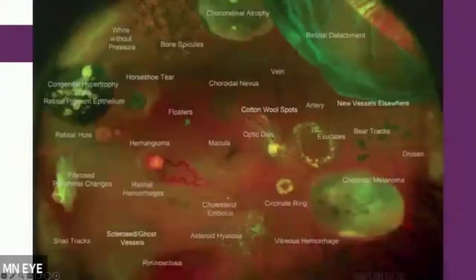A lot of topics are going to be covered in the next 30 minutes or so. This is by no means a comprehensive guide, though. This is a scary picture from Optos, and it shows all the pathologies that can happen and will happen at some point in our life. We are going to see these in our patients, hopefully not in ourselves.